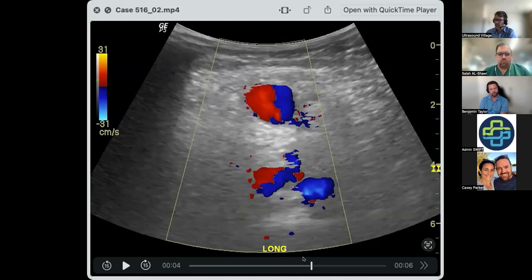Okay. Has anyone heard of the yin yang sign? No, but I'm guessing that's what it looks like. All right, that's not a bad example. It's supposed to be a little more of a swirl on the top, because if you think about what happens with the blood as it comes in, it's going to come in one side, and I'm assuming you can see my arrow? Yes.